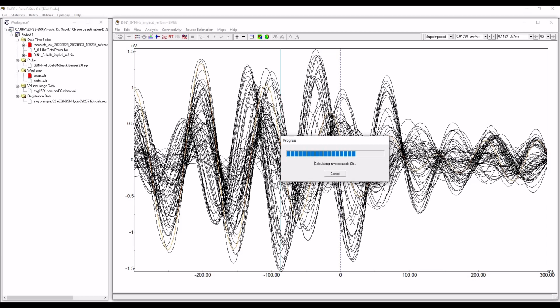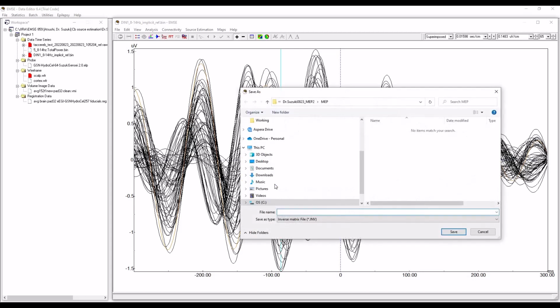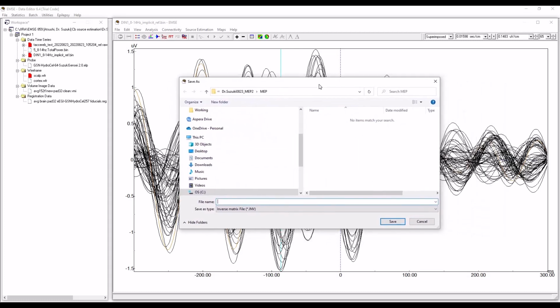It's important, I'll note while this is calculating, that for the forward and inverse, they will not depend on the IIR filter. This won't depend here with this method. It won't depend on the fact that we chose 8 to 14 hertz. But it's spatial, so it does depend on the reference. So I'm going to call this one Loreta.